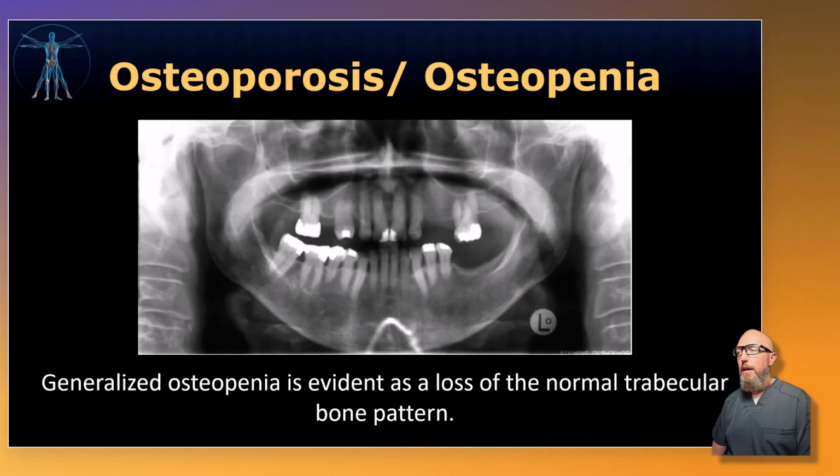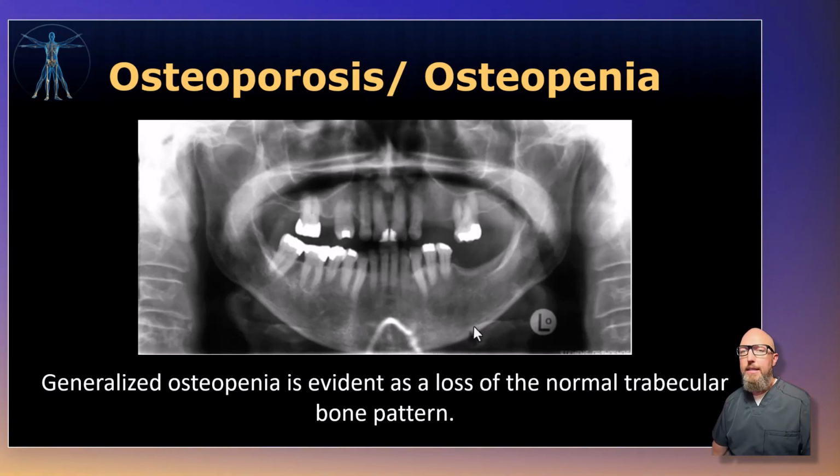If you've been at clinic at all, you've probably seen this. So look at this image against the checklist. Look at the trabeculae size. The normal trabecular pattern is lost. There's a heterogeneity and a thinning of the normal inferior cortex of the mandible. As you can see here, it's lost that nice thick cortex that you usually see.